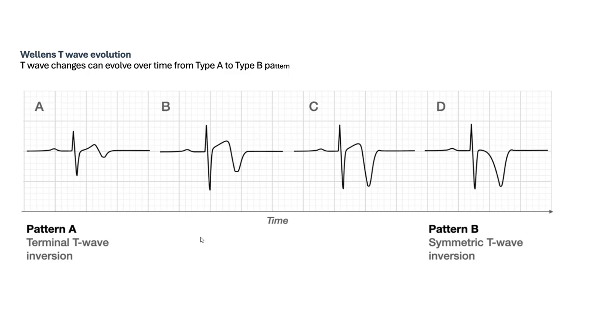Here we see the evolution of T waves over time from biphasic to symmetrical T-wave inversion.